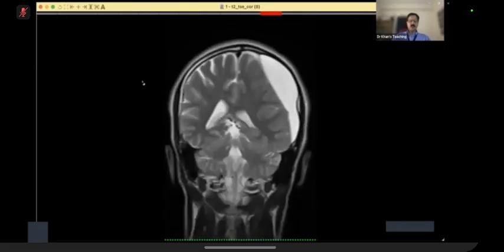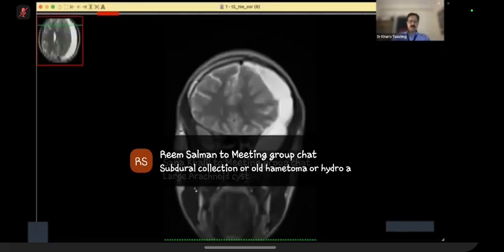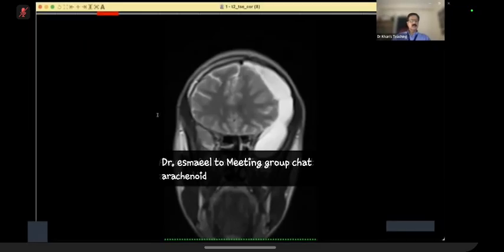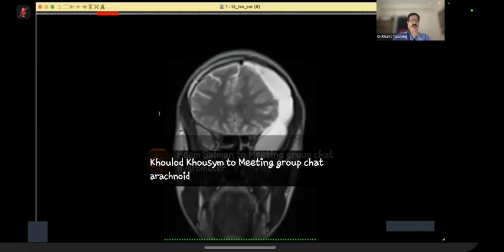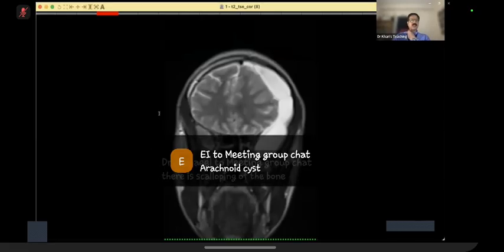Can I ask you the diagnosis now in the chat? Okay. So the diagnosis is that people have said arachnoid cyst. Some people have said arachnoid cyst ruptured.